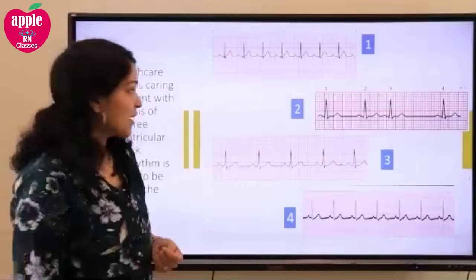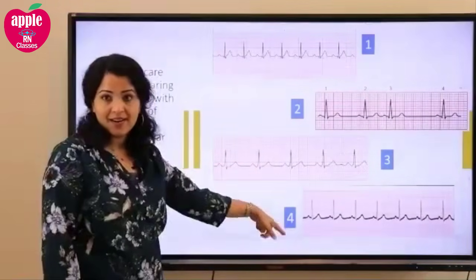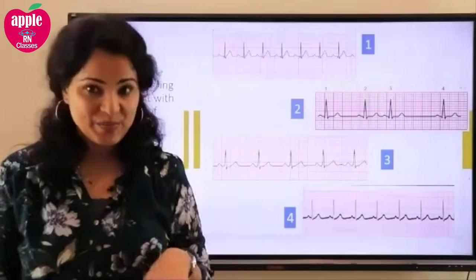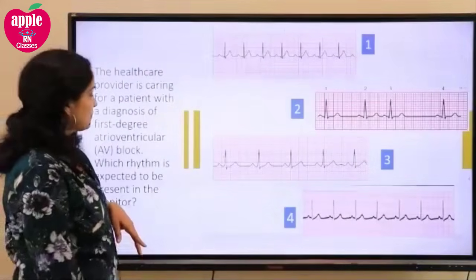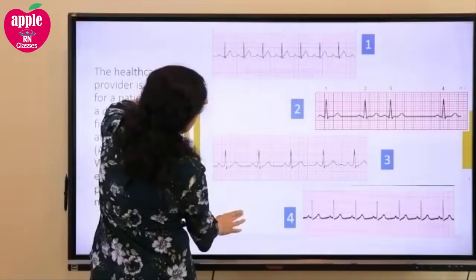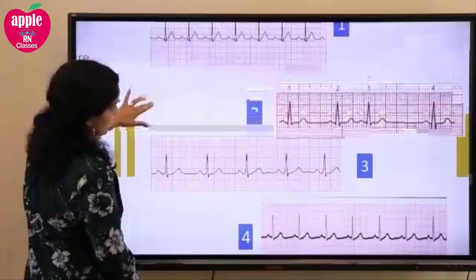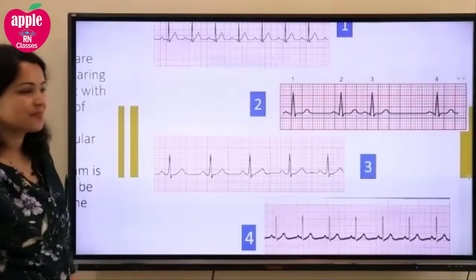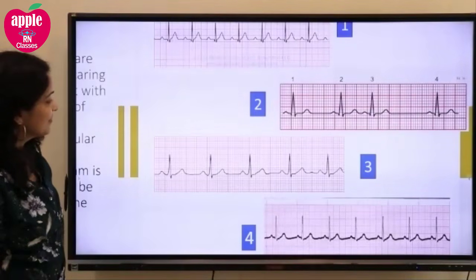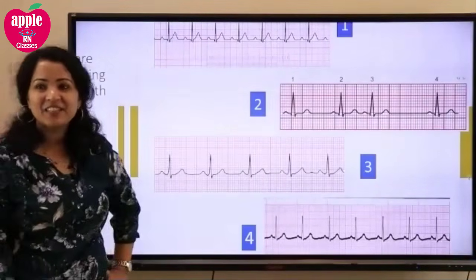And if you can, great. You guys are already answering. I'm very happy about that. So 1, 2, 3, and 4. There are 4 options. Which one is the first degree heart block? First degree heart block. Make it a little bigger. All right, I will let you think about it.